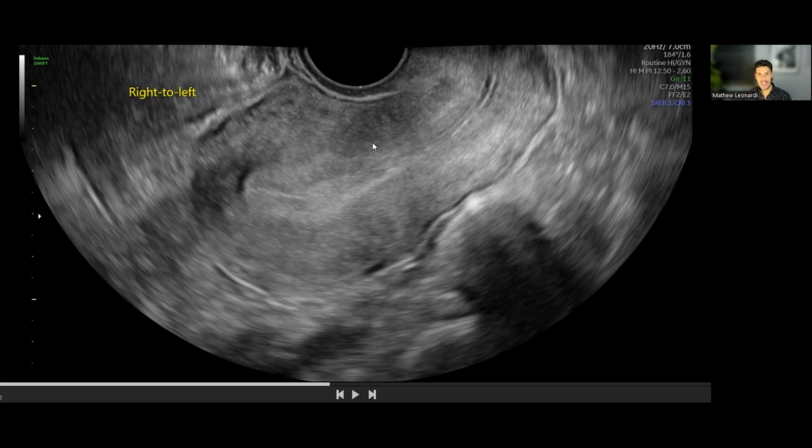If this patient ultimately undergoes a hysterectomy and the pathologist is cutting up the uterus and analyzing the histological characteristics, this is so small. What if they miss that? Is the ultrasound right? Is the pathology specimen going to reveal it? So unclear, but I think overall, this is not really going to be the contributor to the patient's problems overall, as that really is the only thing that I'm seeing there.